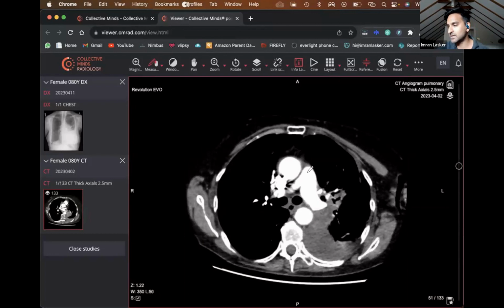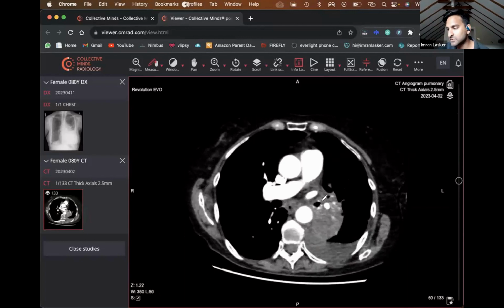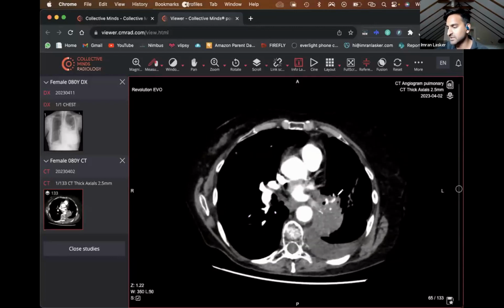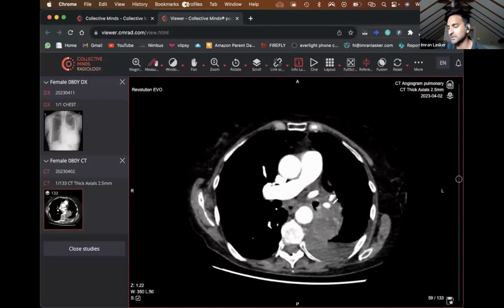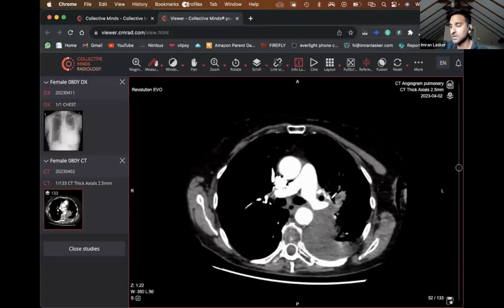But with this patient, you have to be worried that this may not just be a post-infection effusion. Someone said, is it hypervascularized inside the consolidation? No, I think these are normal vessels that have been pushed together. When you look at this area over here, these are your vessels. But when you've got this partially collapsed, consolidated lung, you've got the normal vessels that go through, because it continues through as you'd expect, becoming thinner and thinner and dissipating. So I don't think this has got new vessels. I think a lot of the bits within the consolidation are normal consolidation with some collapsed vessels.